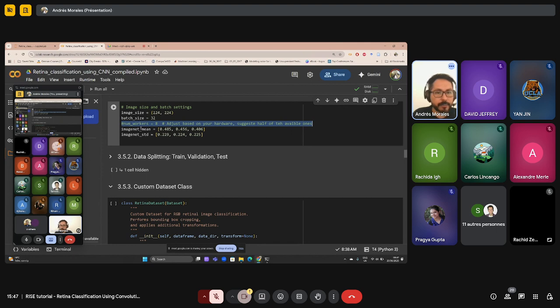So these are the three. So this is the mean intensity in the three colors. As I was saying, we are working with RGB images, like three-color data, 3 channels. So the normalization is slightly different for each channel, and also the standard deviation is slightly different. So what is the idea of the normalization? That you subtract the mean, and then you divide by the standard deviation.